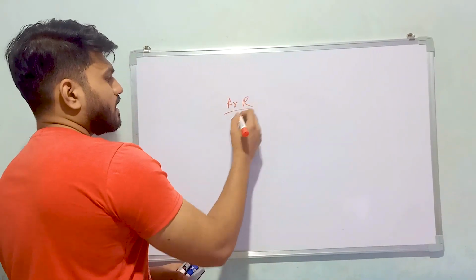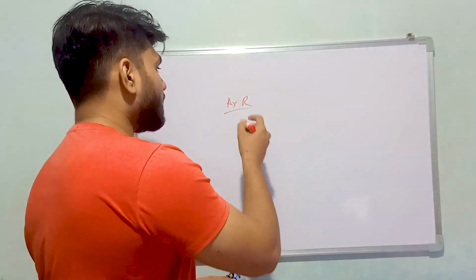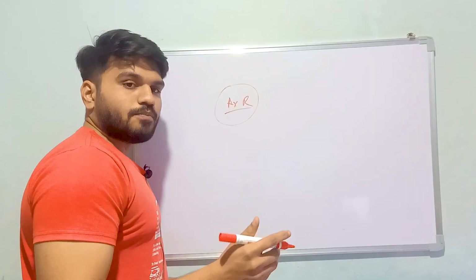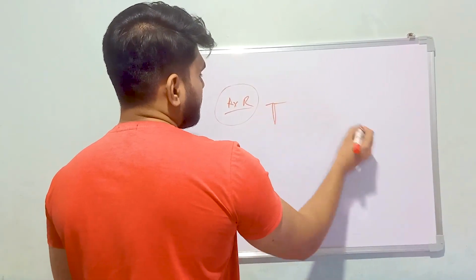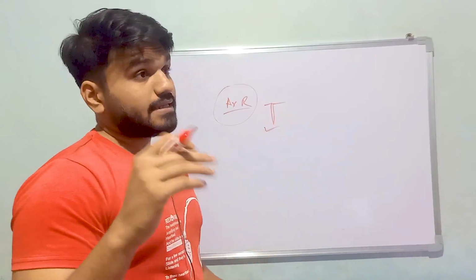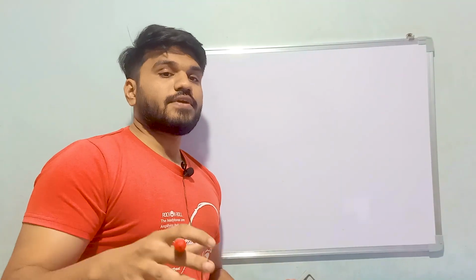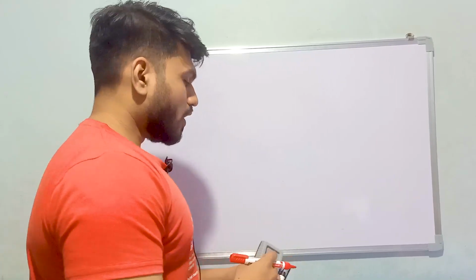the AVR lead. You already know that there are 12 leads in ECG. In that, we have to look at the AVR lead. It should be negative. The AVR lead should always be negative, and this represents that this ECG is taken right. If you want to understand how this AVR lead will be negative, you have to understand this.